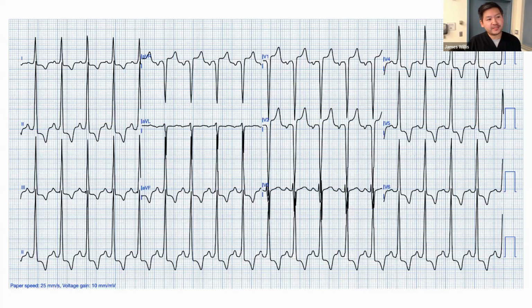Just another example, I see this pattern a lot in tachycardic patients with LVH. This can be misinterpreted as aVR ST elevation with diffuse depressions. Is this a left main occlusion, or is this patient just dehydrated? It's very difficult to assess here, but you do see a lot of ST depressions with tall R waves and ST elevations with deep S waves.